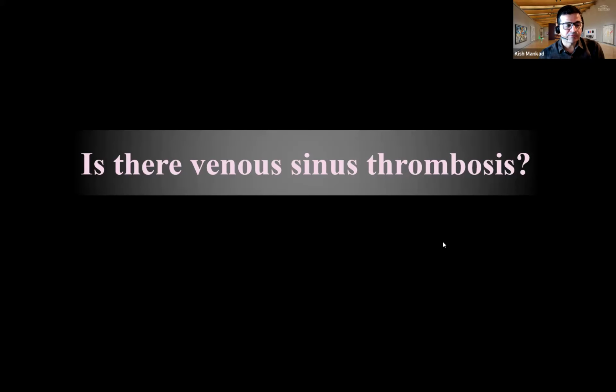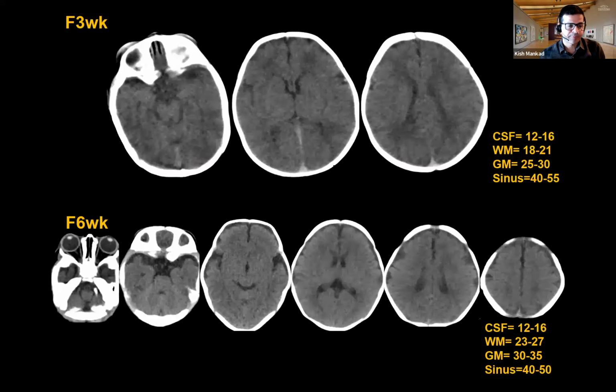And you have to make a difference by either diagnosing or picking it up or even speaking to your radiologist and asking them the right questions. The problems and the pitfalls with CT in that respect are as follows. Now, first of all, I will show you the non-contrast situation of a 3-week-old and the same at 6 weeks.